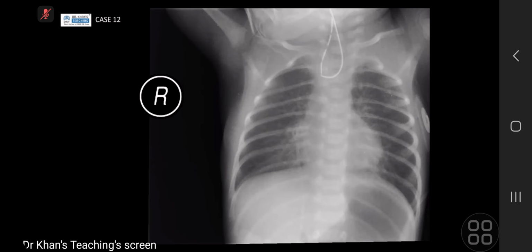Yes, sir. This frontal radiograph of a child demonstrates a nasogastric tube in the upper part of the cervical esophagus, coiled upward. There is no passage of the nasogastric tube to the gastric bubble.